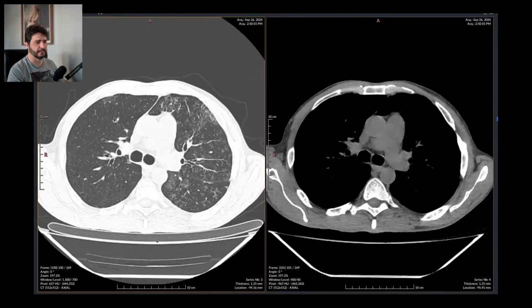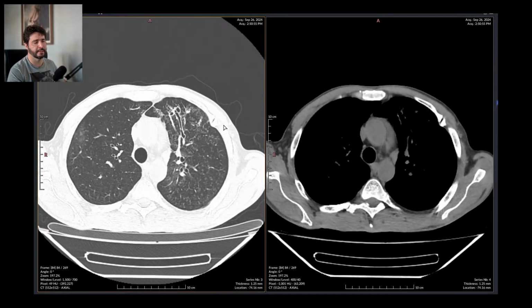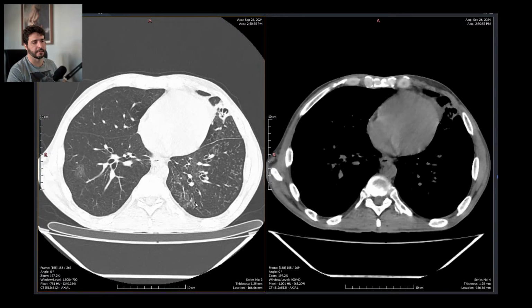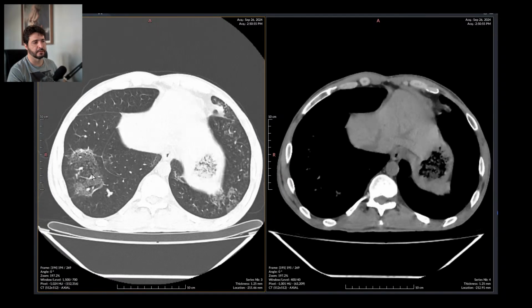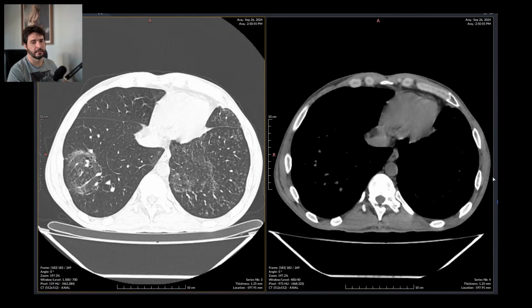This is some kind of acute disease with a pulmonary distortion, both parenchyma and airways, and it's spreading through the airways and obstructing the smaller airways, just like that.